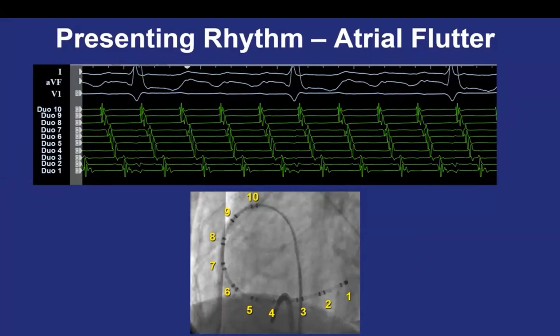I'll tell you one small piece of information. This has something to do with the breakthrough from the right atrium to the left atrium. If you break through down, you are going to stimulate the left atrium from below, and that will give you the negative P wave. If it is clockwise, you are going to stimulate the left atrium starting from above, which will give a positive P wave.